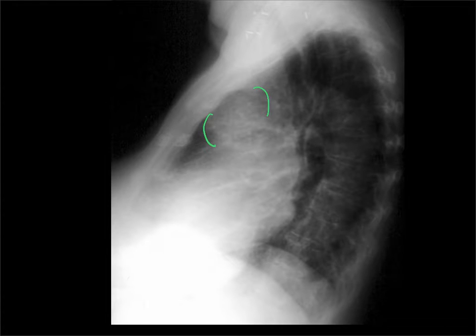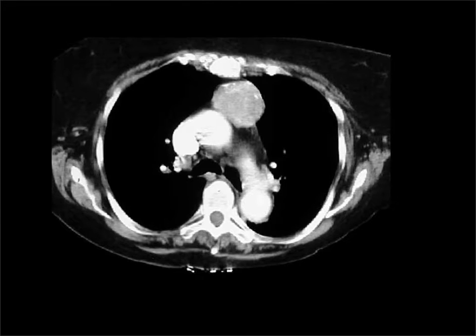This bulge here, you can see it's definitely falling out of that normal lentiform shape as a bulge. This was an elderly lady with myasthenia, and if you remember, you might not be that surprised to know that this is a thymoma. So bulges in the retrosternal space might be a dilated ascending aorta, or it could be a retrosternal mass, such as a thymoma, a thyroid, lymphoma, and so on.